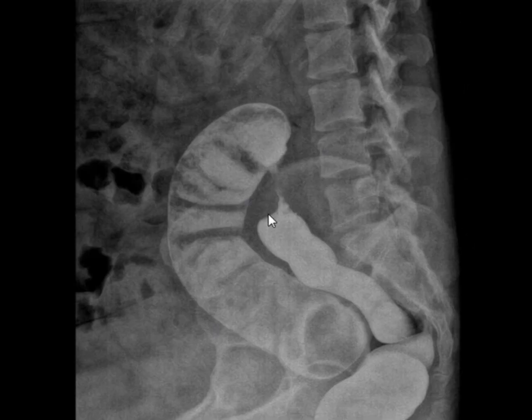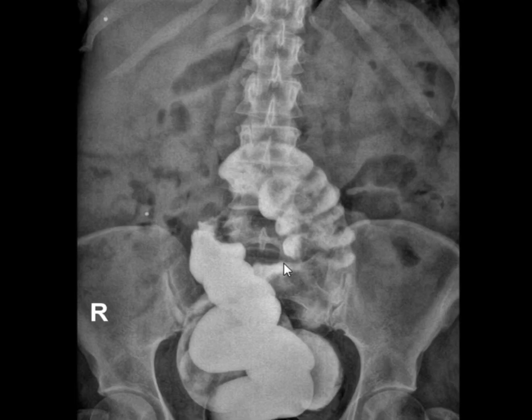What else? What's going on? There is a structure here. Excellent. What kind of structure? What do they call it? Apple core lesion. This is a typical, the best apple core lesion you will see in your entire life. It's as if someone ate the apple from here and here and left the core. What's the differential diagnosis of apple core lesion? Carcinoma. First of all, sigmoid or colon carcinoma. And what else? Crohn's, because of continuous loss of haustration or striation or whatever.